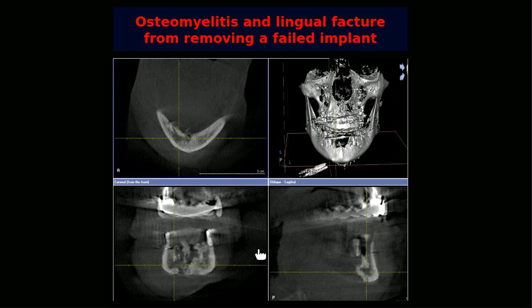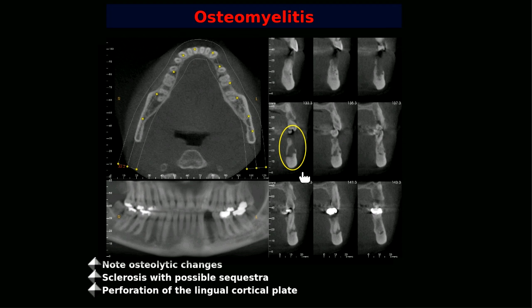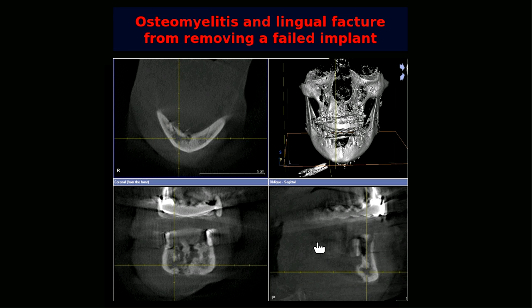So you must be thinking what kind of treatment we can give for these cases. You may give IV antibiotics, and in the hospitals they give it. In this case, oral antibiotics hardly work. You can also see this is the lingual side in the axial view. There's a fracture on the lingual side. The implant failed. They took it out, and that's how it started.